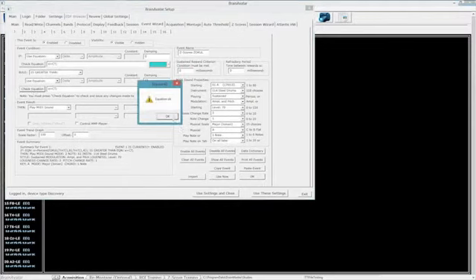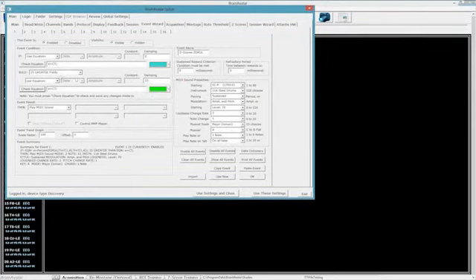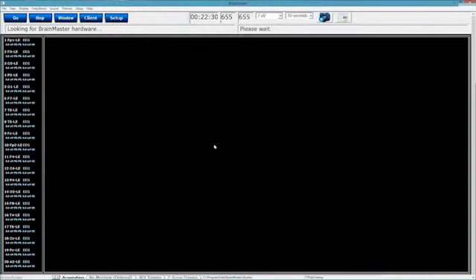Okay, so here we go. This is so you guys can see what's kind of going on right here and what I'm referring to, okay? We have the same function that we're using right now, which most of you guys who have done Z-scores know, the CT basically is the C threshold for the upper or for your Z-score training. But to go into it a little bit further, I'm going to show you what the difference is. So now this one right here has a damping of 0 and this one has a damping of 15. So I'm going to hit Use Settings and Close, and I'm going to hit Go.